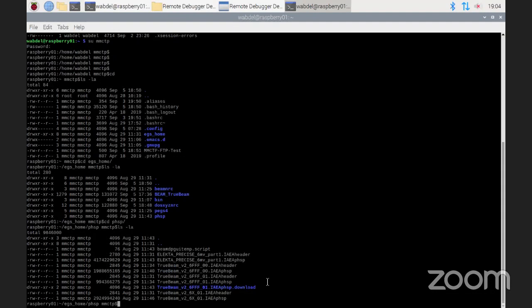This directory has the sources for my BEAM. With Varian Linacs, remember they don't give you anything above the jaws, the geometry. So they give you a phase-space file that represents the particles just coming above the jaws.